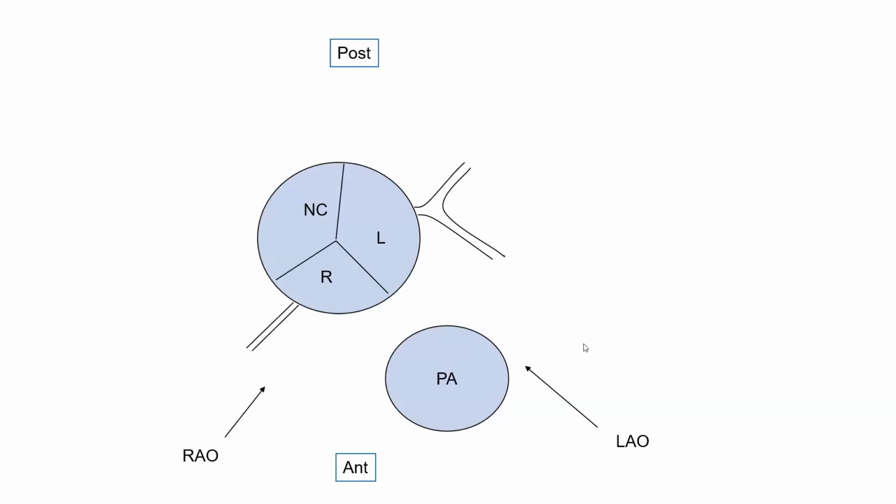You really do not need a CTA to define the course. You can use a CTA to assist you, but I can almost always define the course by angiography.